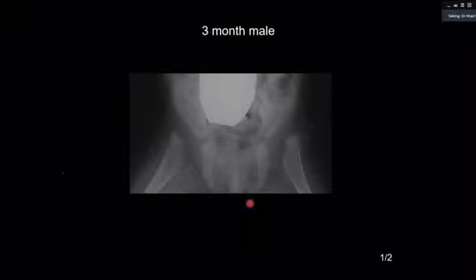Right. So you have done well. You have picked up the diagnosis, which is developmental dysplasia of the hip and bilateral dislocation or subluxation, whatever. But the point is that your description started with the diagnosis. And the diagnosis was correct. You started off with the diagnosis of bilateral subluxation or dislocation, whatever.